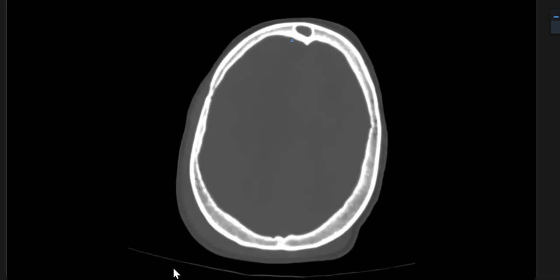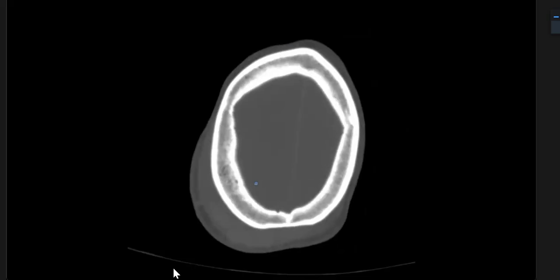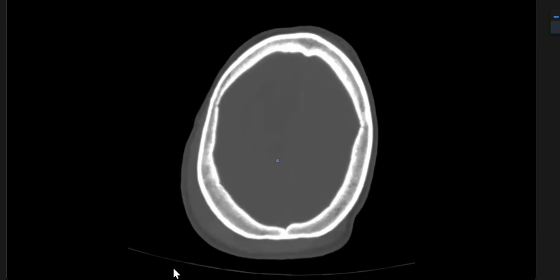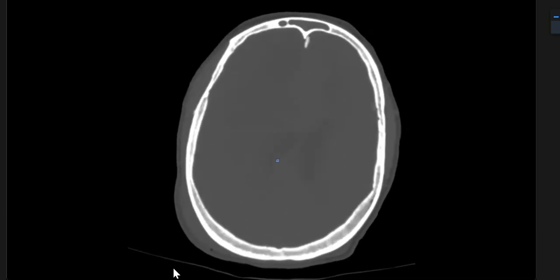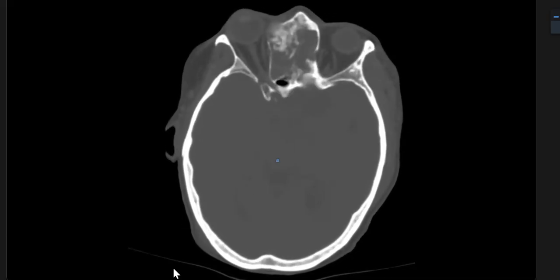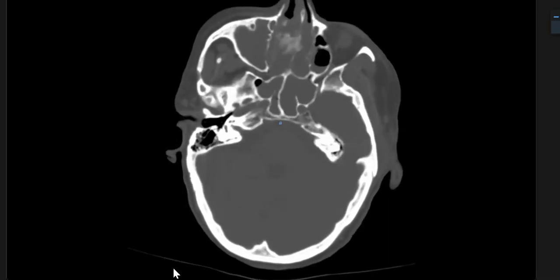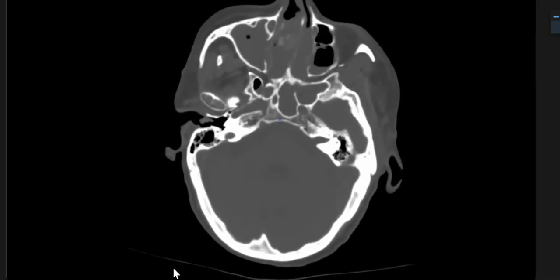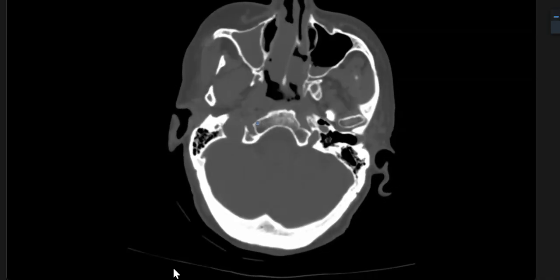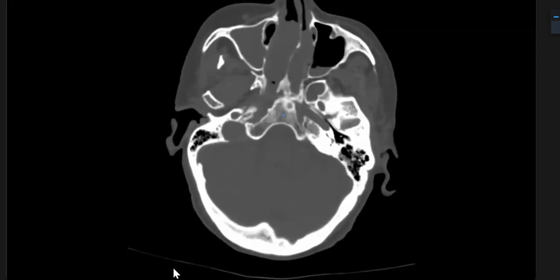Okay. And I can see also there is extracranial scalp hematoma noted. You can ignore that. I think also there is sclerosis seen here and areas of lytic lesions within the clivus and the petrous bone. Where is the destructive lesion? Sorry. Lytic lesions, lytic areas seen here.